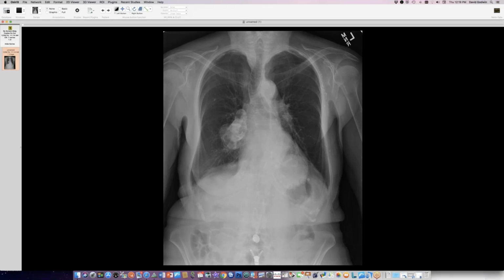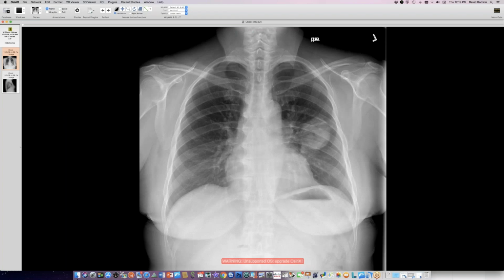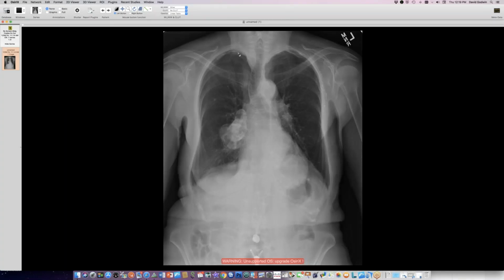So are there funny calcifications, David, in the apical hemithoraces? If you zoom in there, I'm just curious. Sometimes you'll see pleural calcification up here. Are those pleural or vascular, or what are they exactly? They're kind of curious. Just caught my eye now. Yeah, it's not pleural plaque. That's the important thing to recognize. So the pleura can calcify up there, and I think it's just degeneration.